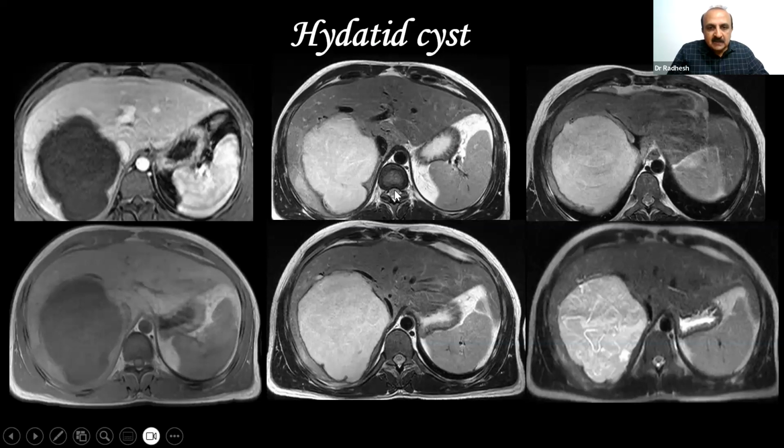Okay, so we'll take this example. Now, this is T2 weighted, no? You see the spine, you see the cord here, you see the CSF. This is a T2 weighted sequence. And this is the fat, subcutaneous fat. This is the fat, gastrohepatic or gastrosplenic ligament. Okay, now you see this sequence. This is the fat. Fat is black.